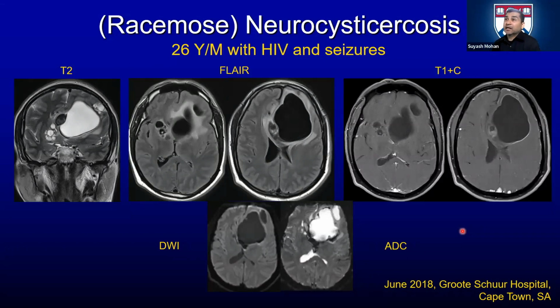Now, lessons learned for me. Lesson number one, I've been teaching you, look for the scolex, and I did not follow what I've always been teaching myself, right? That's the scolex. The second thing, Professor Mohan always talks about, look at the signal of these cavities, right? Are they suppressing or not, right? In many tumors, in most tumors, tumor-associated cysts usually will not suppress, right?